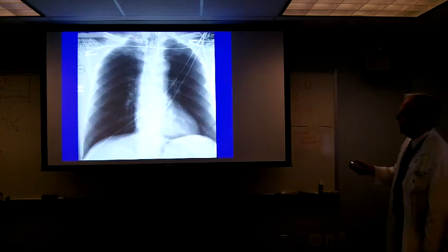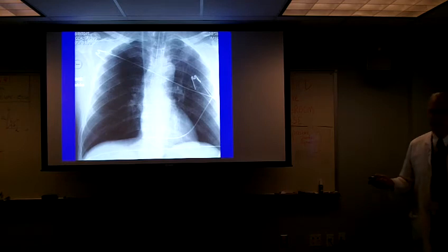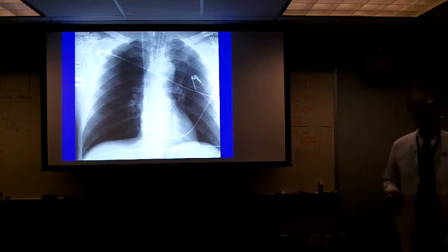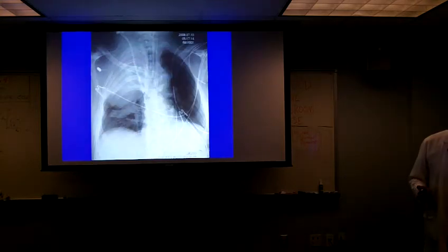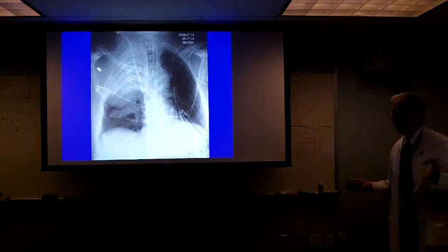Look at this area up here. It looks pretty similar to the left side. But now, there's some extra density up here. And one day later, it looks like this. So who can tell me what happened?